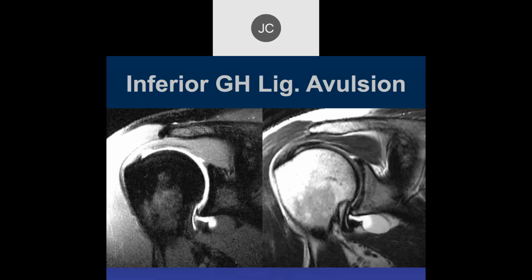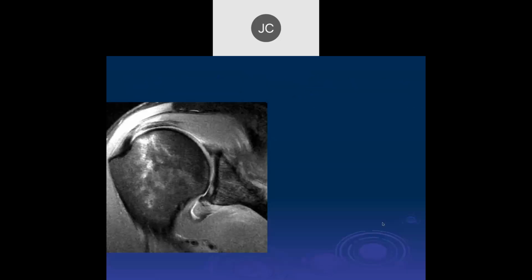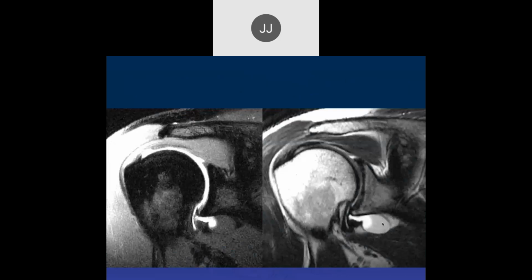But a lot of these paralabral cysts, it looks like fluid in it, but in reality, it's a gelatinous structure because a lot of the water gets resorbed. And you can see where the contrast is kind of slowly diffusing into this gelatinous structure, which is inside the paralabral cyst. And would you say there's a lot of protein in there? Yeah, probably.